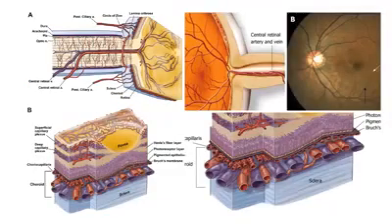So as we know, when we say posterior uveitis, we are talking about the posterior part of the eye. We are talking about the retina, including the macula, the optic nerve, the retinal vascular circulation, the choroidal circulation, and also the sclera. And we should not forget to focus on the superficial plexus and the plexus at the foveal area.